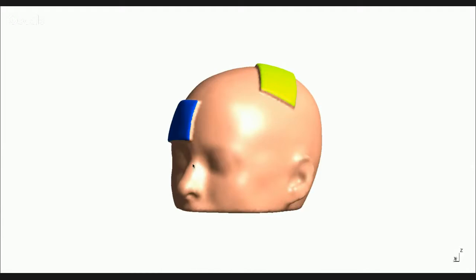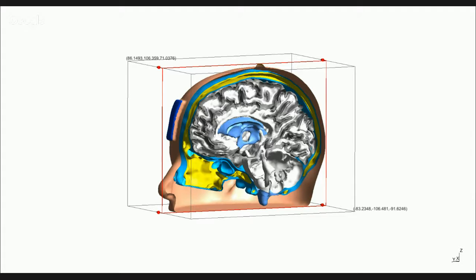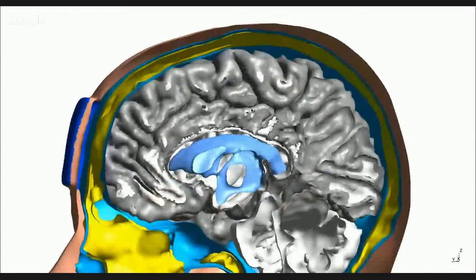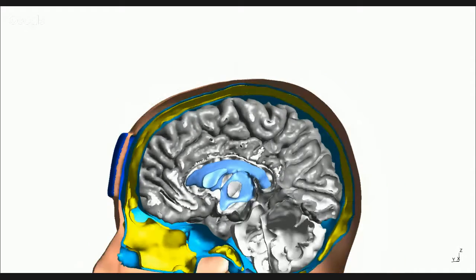Once you run the software, you can create a 3D head model. That's what you can see here. It is made of different tissues. That was a special case where we looked at different skull layers, optimized for TDCS. The skull has different layers: compact bone and spongy bone. Spongy bone has more fatty tissue and a higher conductivity, and we showed that those areas are preferential pathways for current entering the head. Also ventricles, white matter and gray matter.